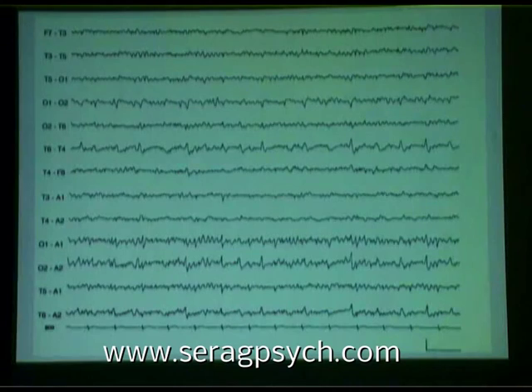Okay, the anterior part of the calcarine cortex will go out to T6. So this cancellation is not a surprise when you're dealing with occipital seizures. You can see them here in this referential recording, O1 to the left ear, O2 to the right ear. This is very interesting actually because there's an awful lot of sharply contoured waves in the background activity, but then you can see these as independently occurring right occipital spikes.